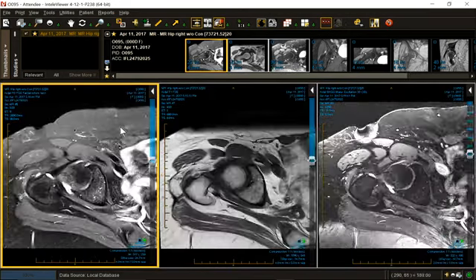I could make an alpha angle for you. I probably would draw it right here, and we'd get something like 75 degrees. The patient has a bump cyst complex. Let's go high. Not so easy to see that labral tear up high, is it? On the axial projection. It's easy in the coronal. So now you've seen one on the radial, you've seen one on the sagittal, now you're seeing one that's very easy on the coronal.